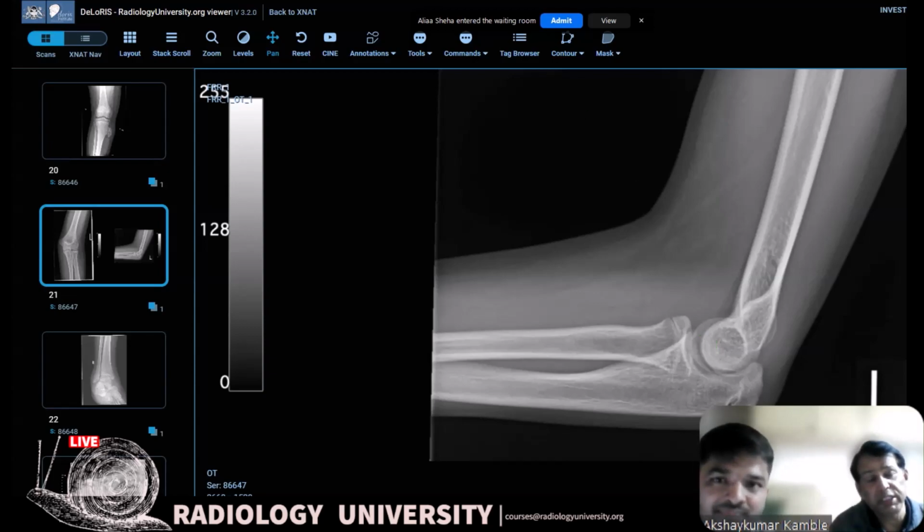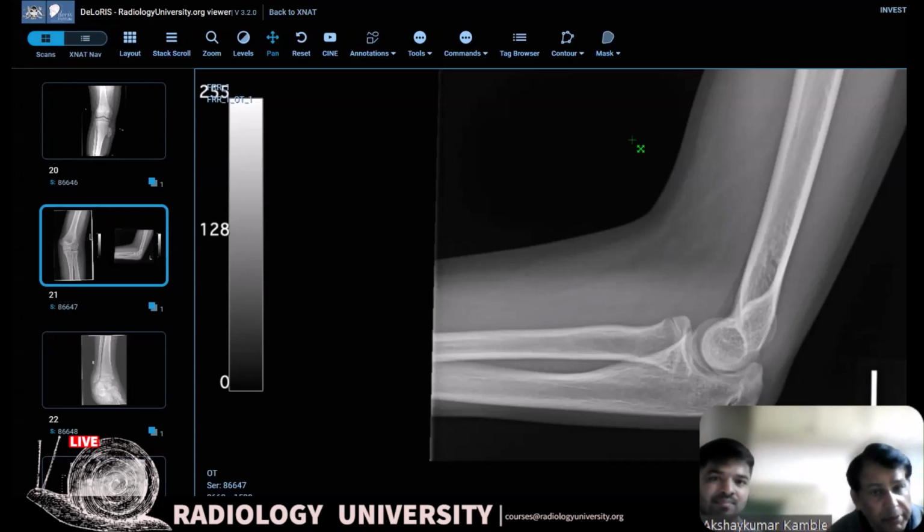An anterior fat pad which is displaced is also abnormal. So if you just write fat pad prominent posteriorly and question mark intra-articular, maybe you will get half the mark, like out of 2 you'll get 1, but at least you'll get it rather than not calling anything. Yeah, okay.